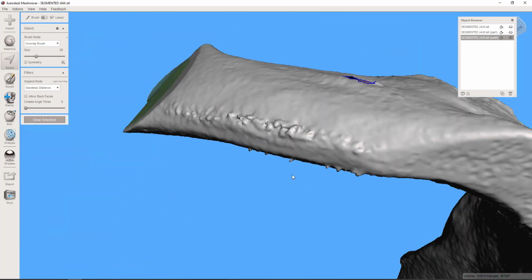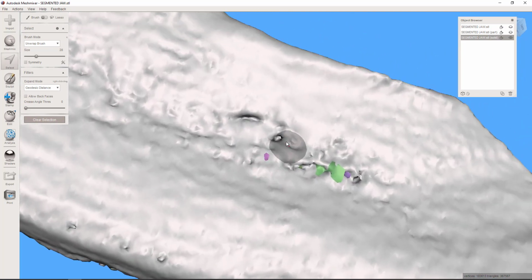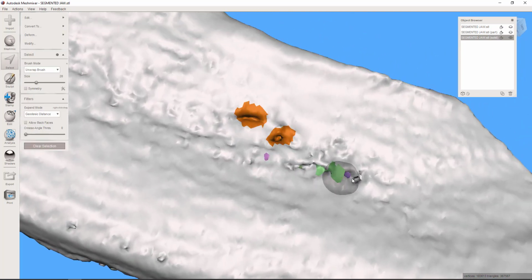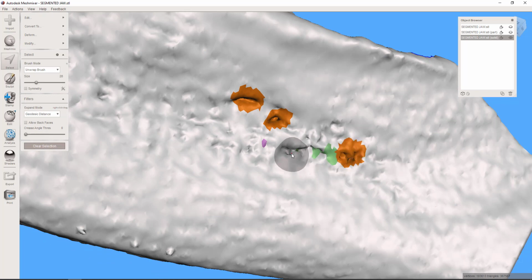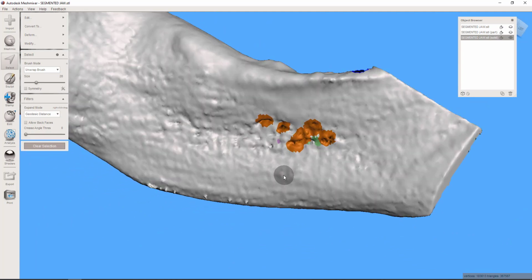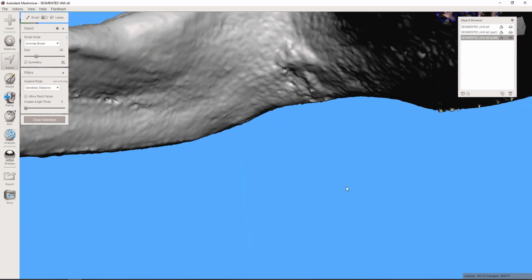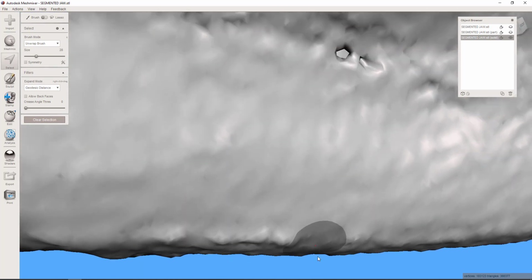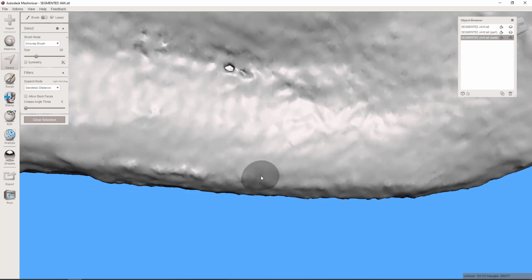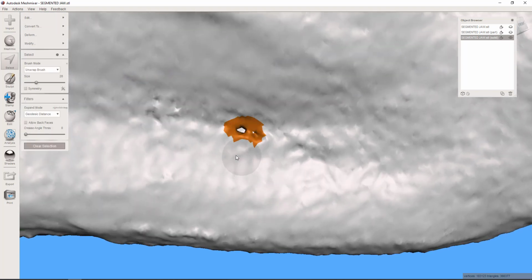And then it's very common to have some right down in here. This is a very thin area usually, so it will often not have a thick enough cortical plate to give a really solid rendering. I'll show you here in a moment how we'll be able to tell if it is still connecting anywhere inside to outside. Okay, that's clearly a spot where it is. Erase back.